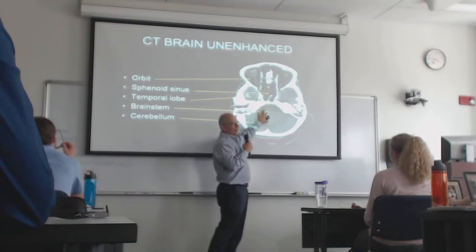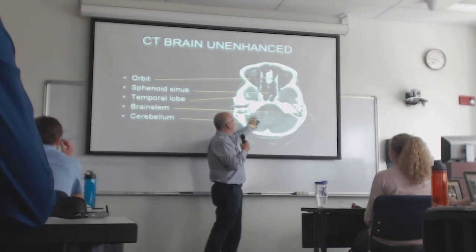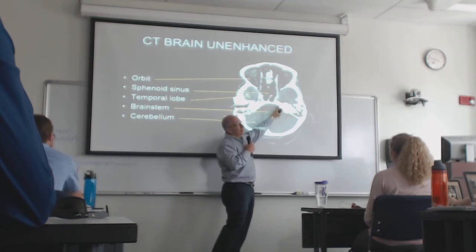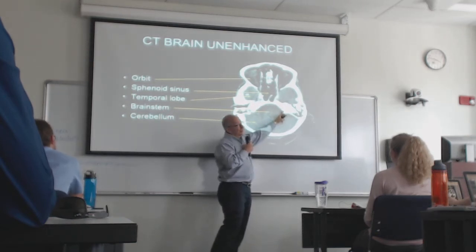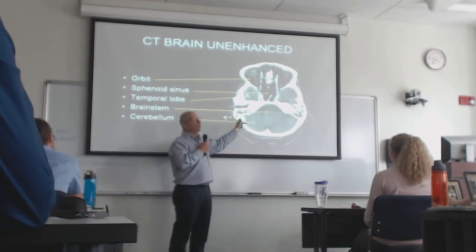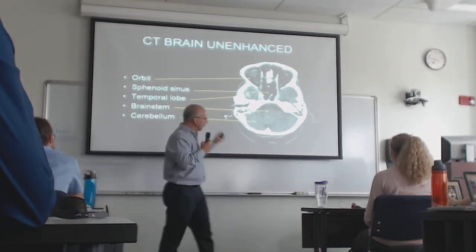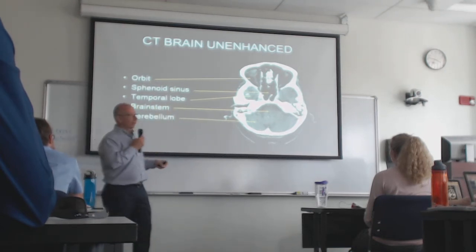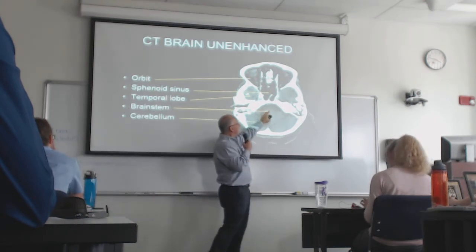The problem with looking at CT scans of the brain way down low is that these bones, the base of skull is a little higher, but this is really dense bone, which is where the inner ear lives, in the temporal bone. Okay, the petrous portion of the temporal bone, right, causes a lot of artifact in CT scans. Very difficult to be very precise on CT scan.